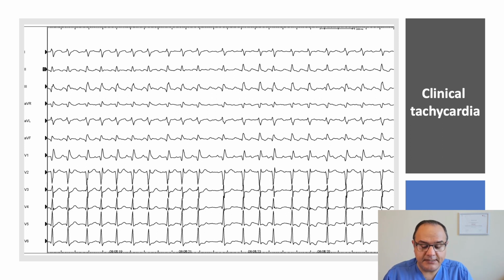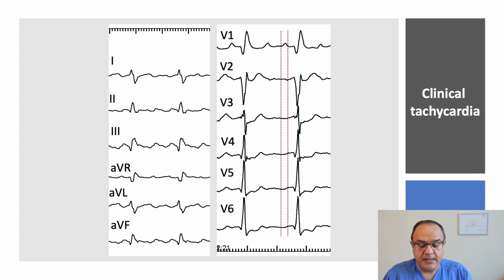The 12-lead ECG at first glance looks completely like typical atrial flutter, especially in the inferior leads and in the precordial leads. If we look closer at the precordial and inferior leads, this is typical atrial flutter. On the right side, we see the typical pattern of P-wave morphology break, starting in V1, V2 with a positive wave, and then isoelectric, and finally we see a negative P-wave or flutter wave in V4, V5, V6, which suggests a right atrial origin. So the ECG looks exactly like the first patient and looks like a typical atrial flutter.